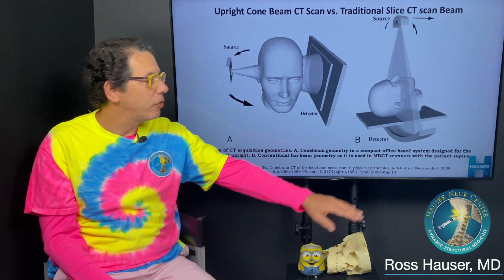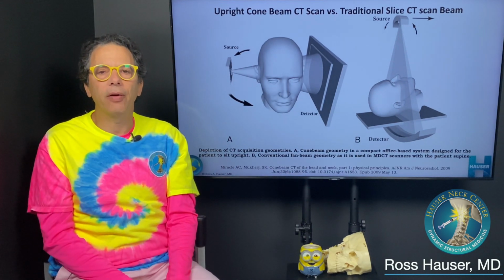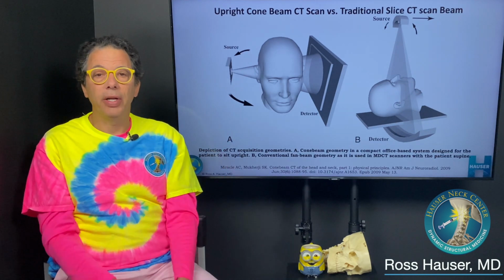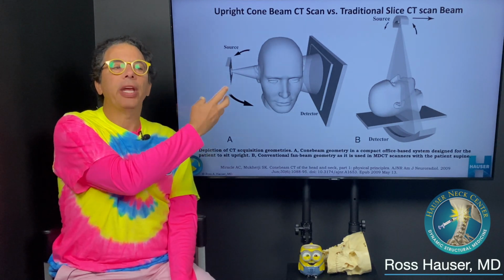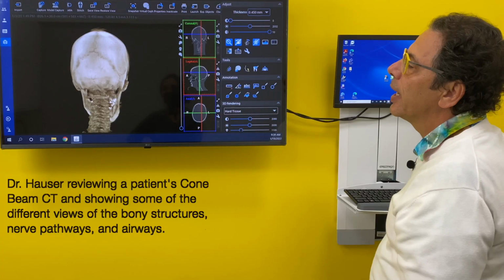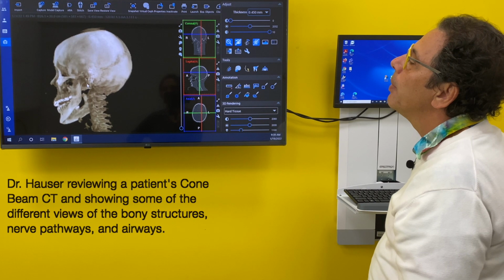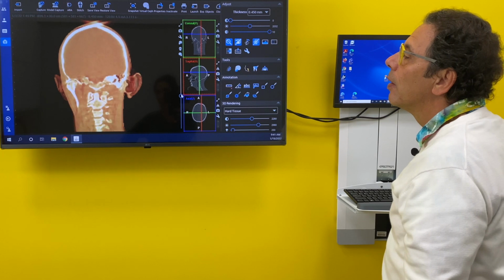And this is the difference. A traditional CT scanner does slices. CT scanning is computerized tomography. So it's basically X-ray beams with different angles, and a computer making an image of it, and you can modulate that image. I can make the image darker, I can make the image lighter, I can change the angle. So you'll see images and turn them upside down. We can make the bones look real white. We can have different shades depending on what we want to see.